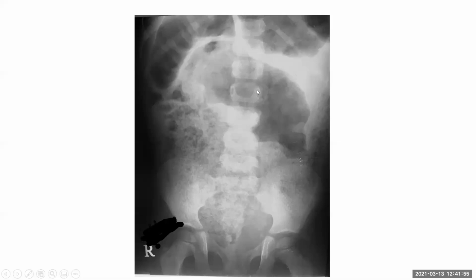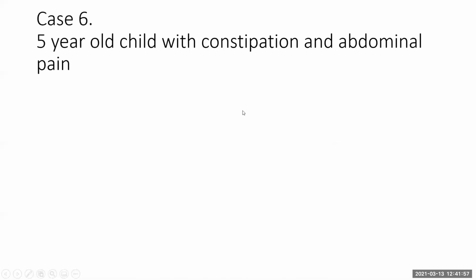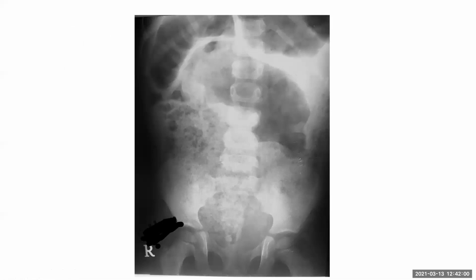Yes. So this is dilated bowel due to the Hirschsprung. I think that was it, right?